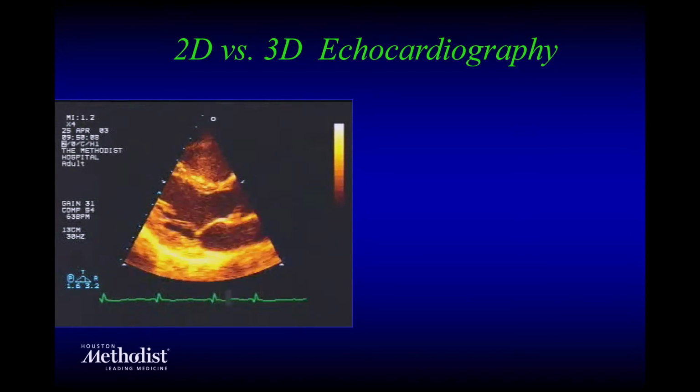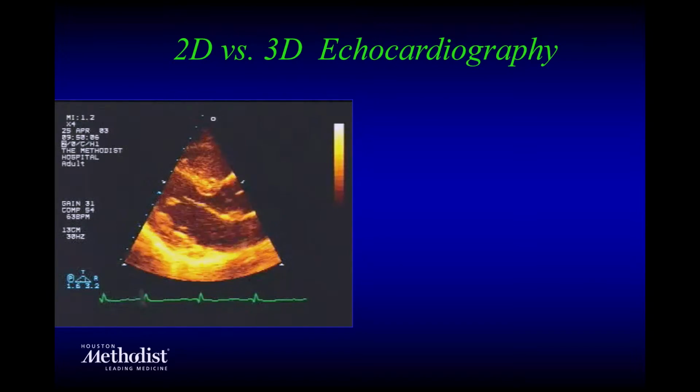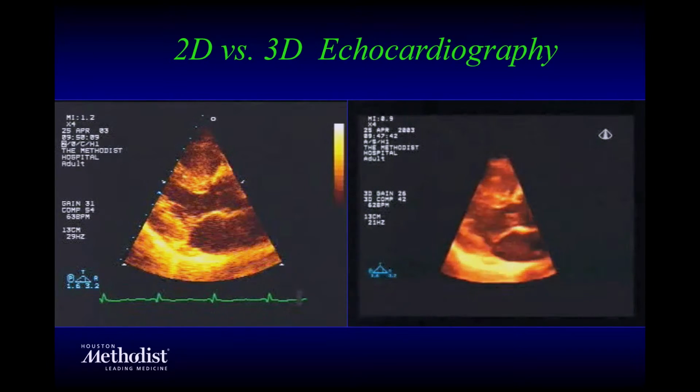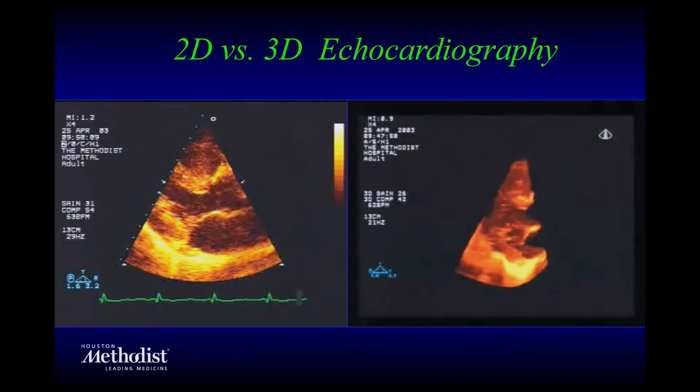3D certainly has had quite a bit of an impact, particularly ventricular function and some for valvular heart disease. I always keep showing this because this is in the earlier days of 3D. This is 2003. The images were not too bad. But in 2003, and this is actually from one of our fellows, I keep it from a historical perspective, who is now not a fellow, but certainly an attending and a big shot too.